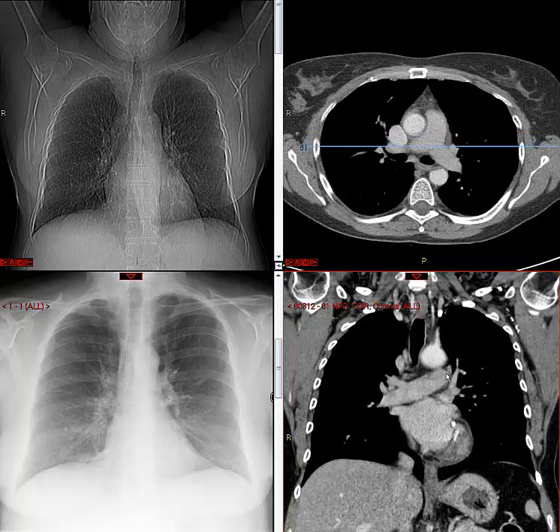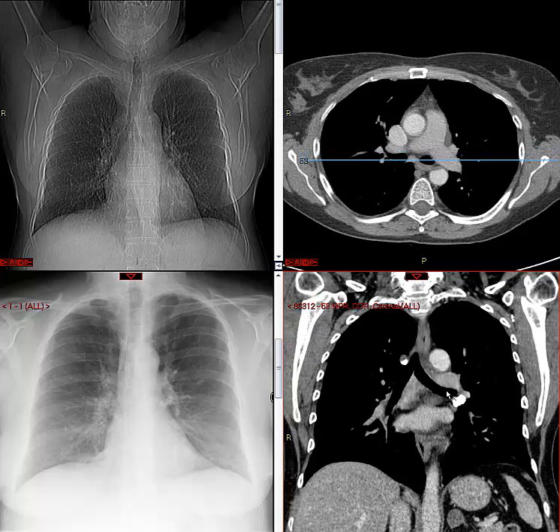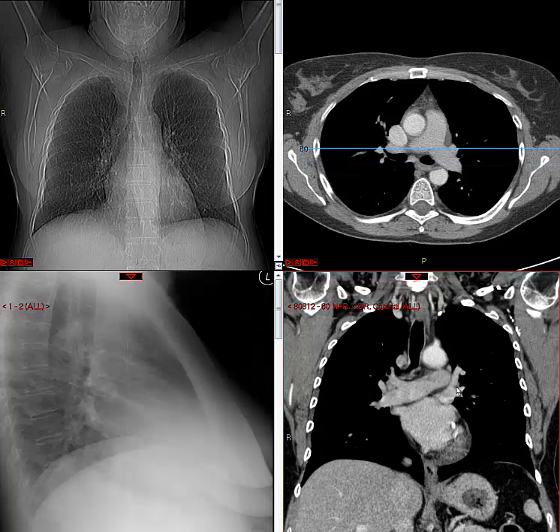Pulmonary trunk is here, and then this is right and left main pulmonary arteries. Where the pulmonary trunk and aortic arch meet, there's a concavity called the aorticopulmonic window, and frequently you'll see a lymph node in that area.